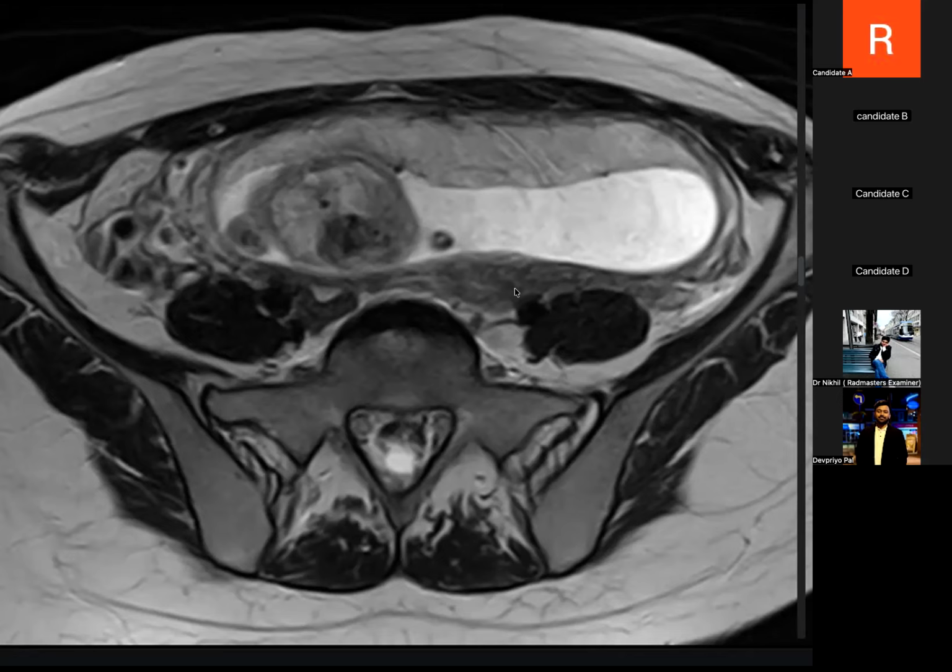So if not for dermoid cyst, what other possibilities could you consider in a pregnancy for a cause of torsion? Like if you see a lesion like this and you say torsion, what else can you think of apart from dermoid? Other possibility could be a theca lutein cyst. Corpus luteal cyst also. Right. So could you roughly give me a possibility of in what gestational age group will you see a torsion of ovaries in pregnancy if it were to be a corpus luteal cyst?